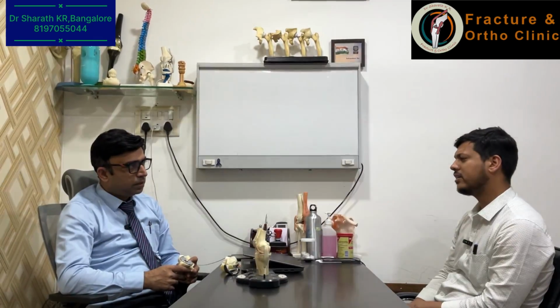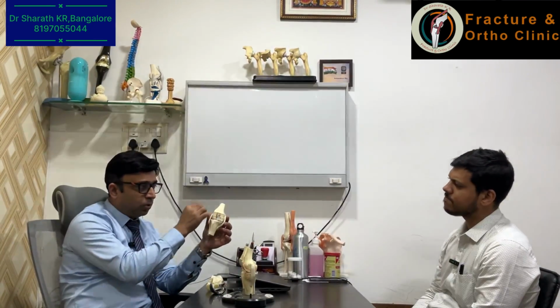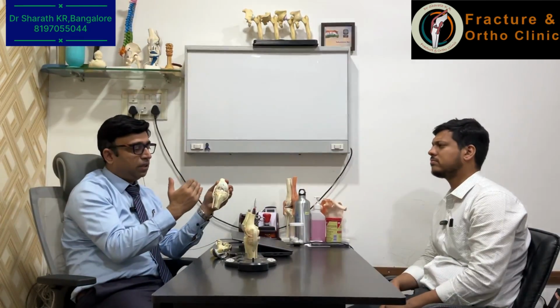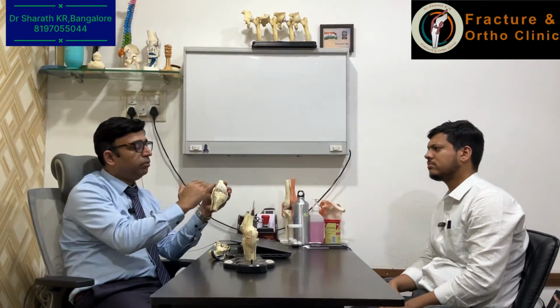And what is haptic boundaries? There are two kinds of robot. One is imageless, the second one is image-based robot. With the imageless robot, we take the instrument given by the robot and map the bone, then the system will recognize this bone and create a 3D virtual model, and based on that it will go on giving information and we will be operating.